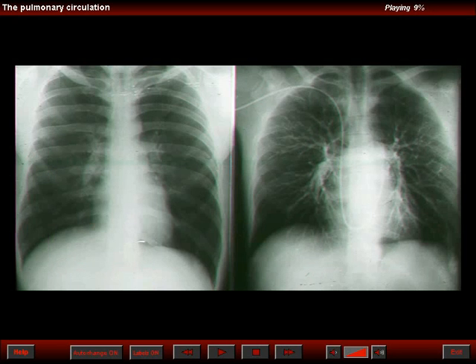This is a patient with a nodule in the left base. There was a large feeding artery and a large draining vein. And on an angiographic examination seen to your right, you can see a filling of the feeding artery, of the aneurysm, and of the draining vein.